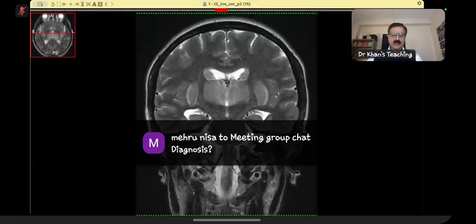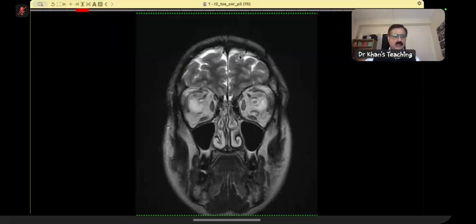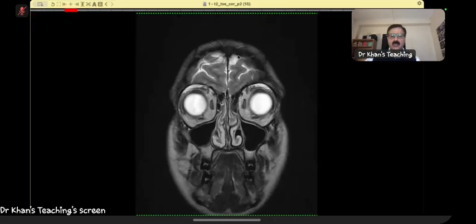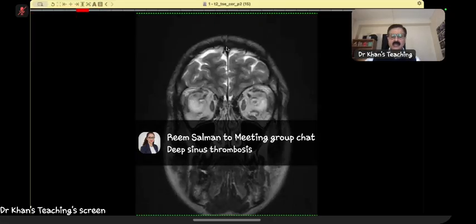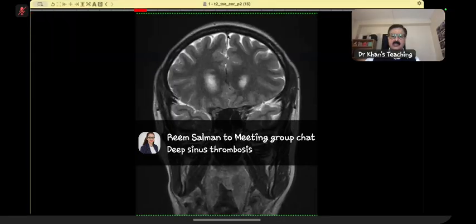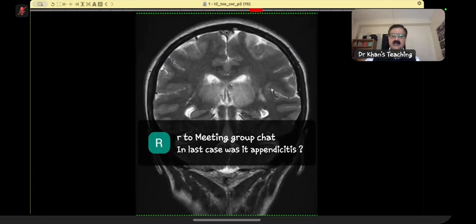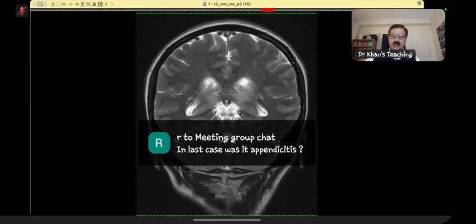In your day-to-day practice, it is my protocol that if you have got a sagittal or a coronal, particularly a coronal T2, develop your eyes to look at the signal within the superior sagittal sinus. This is the superior sagittal sinus. Just keep looking at the superior sagittal sinus, and here the signal goes. It should be dark. It should be signal void.